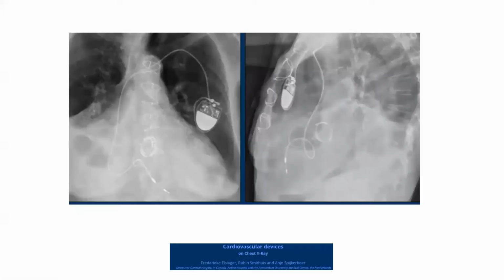Good. Well done. Now, what are we seeing here? Anybody can take this? This is the mitral valve. Yes, very good. Mitral bioprosthesis. Agree with you. What else? Tricuspid. Very good. Tricuspid repair. And what is going through this, the lead? Is it pacemaker or ICD lead?